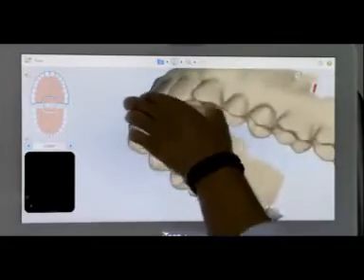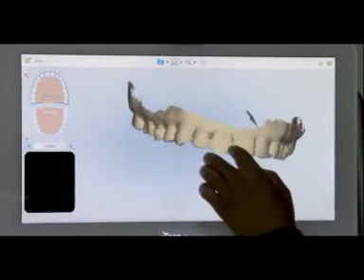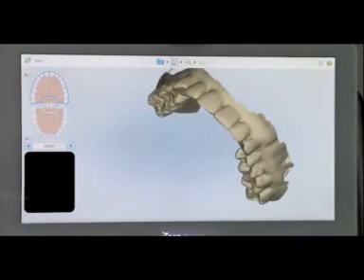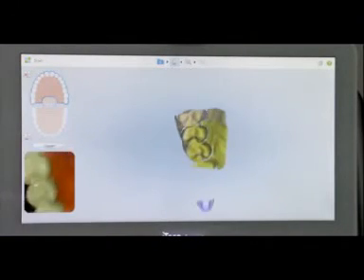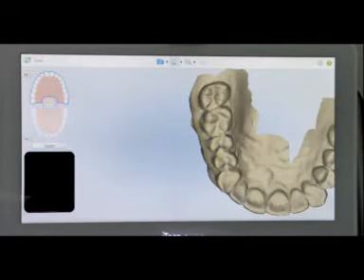Yeah, so I'm happy with that. If this was a patient, I would say those little spots there, go back in and scan that. Okay? And always, if you needed to start again, just go back to an area you scanned before, wait for it to jump in, like that, and then just go around to wherever you want to.